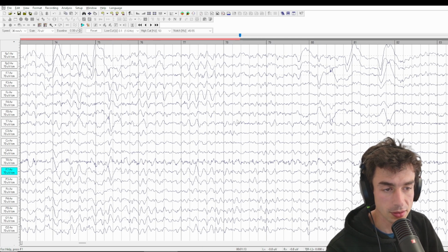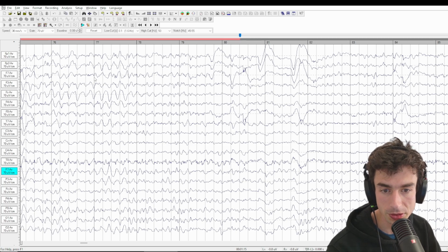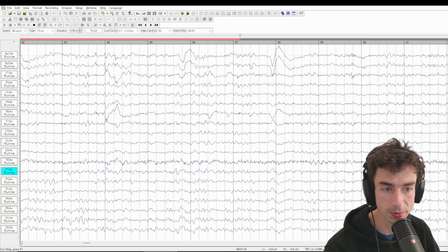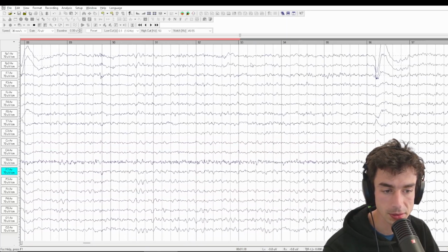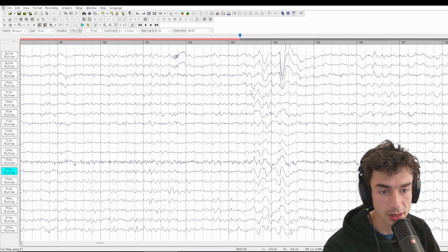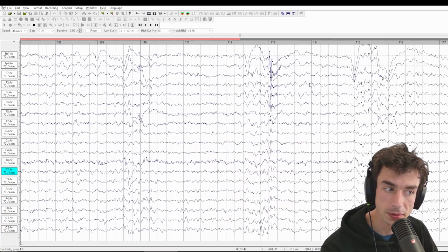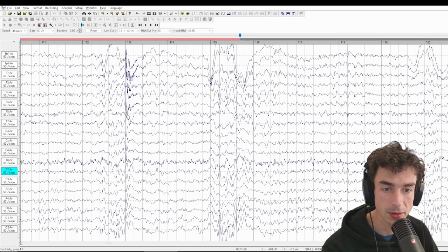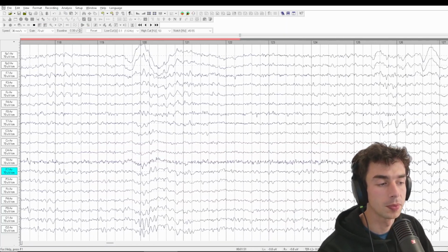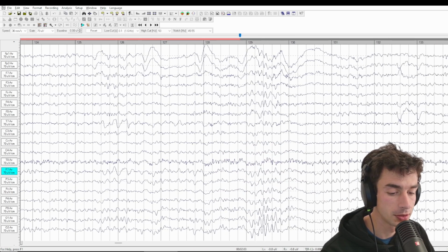So there are issues here in regulating vigilance because we're going from this sort of global slowing, eye blinks, and then to sort of a dropout of the background rhythm with more eye blinks. So it seems like this person kind of struggles to stay awake, and certainly the frontal midline theta in this amount, here we see it again after another eye blink, is something that would potentially impact the metabolic capacity of the anterior cingulate.